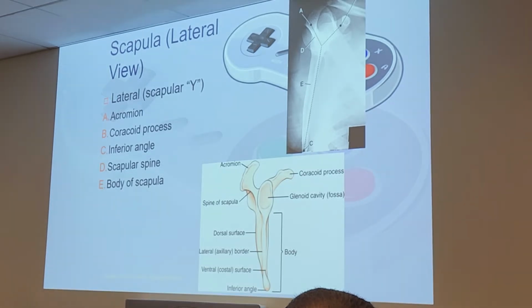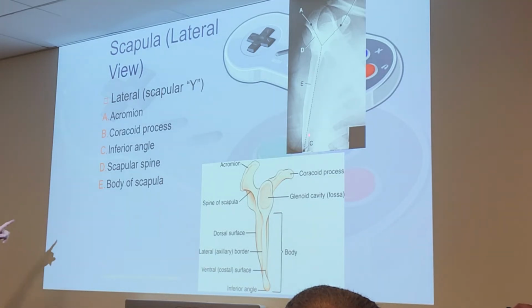We said both ways. And you said that was D, or which part? The superimposed? These will be the scapular spines. They're labeled for you on the side here. The inferior scapular spine. The superimposed portion here, that's the body of the scapula.